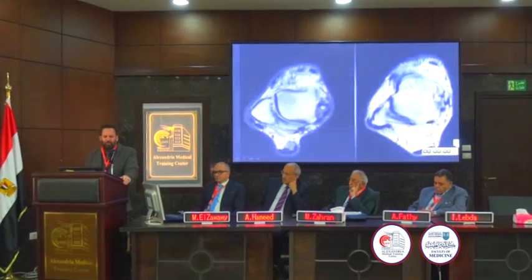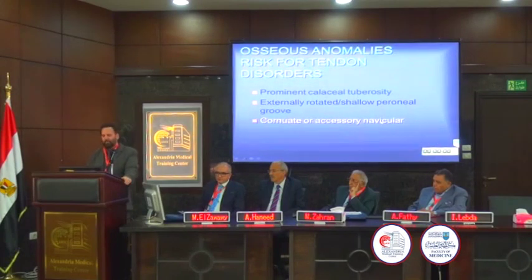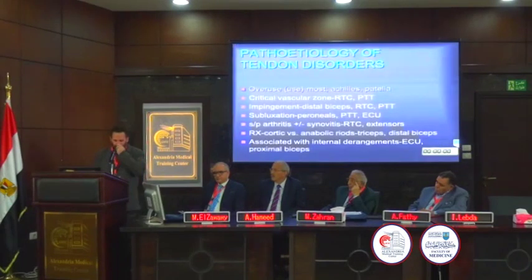And we talked about grooves leading to subluxation. You see how this peroneal groove is not only not concave, it's convex. And another groove, and you see how it forms the osteophyte at the edge to kind of stabilize. And then accessory navicular. Here is a normal navicular. Here is an accessory navicular. 4% of the population has one of those. 40% of people with PTT tears have one of those.